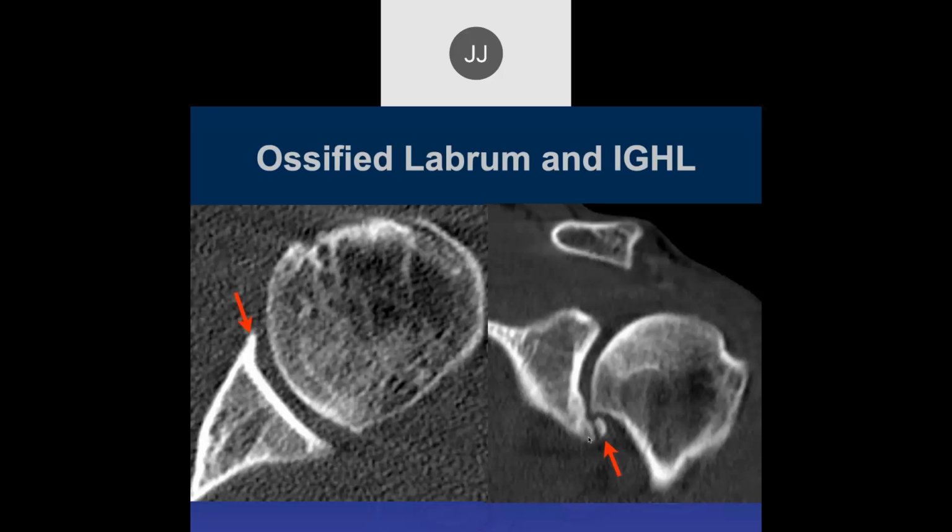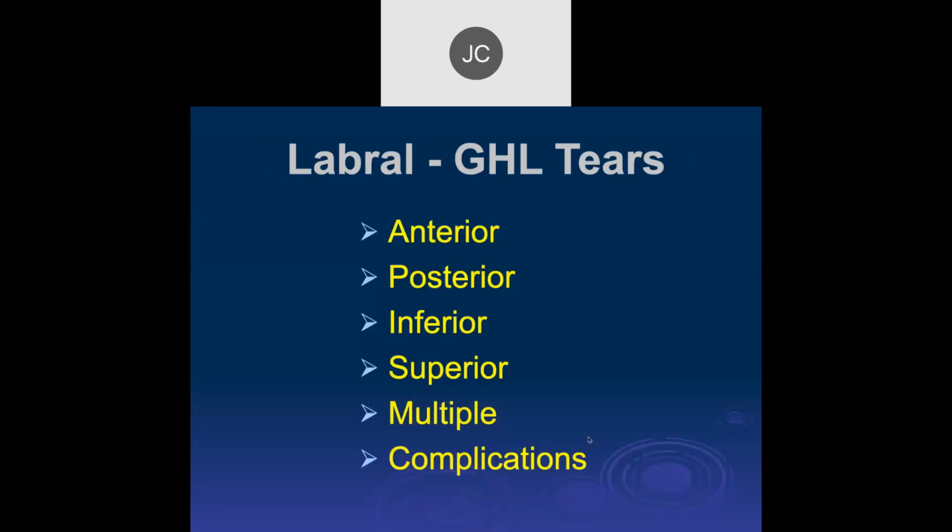When I see these congenital types, you think about achondroplastic dwarfism, which is quite common. And you see a pathology like this. Yeah, well, this patient is on the older side of things, but right, good.